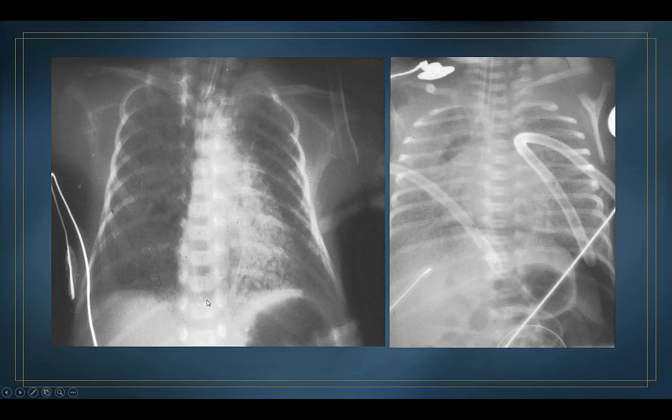And these are horrible slides because they're old slides, but just to remind you, we don't see it that much anymore, but there's no reason why it can't happen. Usually 99.9% of the time a pneumoperitoneum implies a perforated viscus. But back in the old days when barotrauma was much more common with our patients, if you ever had a patient that had a posterior pneumomediastinum, and that's what you're seeing here, is this lucency that tapers as you get to the esophagogastric junction, and there actually is a tubular filling defect in the middle of it that's water density. That's actually the collapsed esophagus.